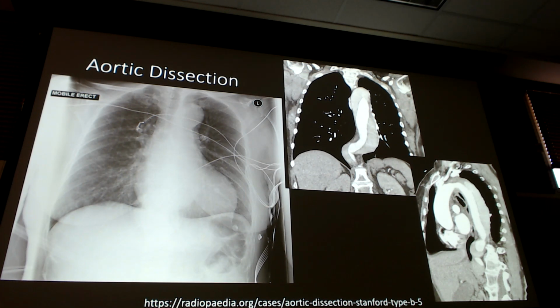Blood, because of pressure, got in between those 2 layers and started going down and ripping and tearing the wall layers apart. And so now what you have here is almost like a pseudo aorta behind this wall layer where some blood, and therefore contrast, is getting in. That's what your dissection looks like. It's contrast in both, but one is more than the other because a little bit's getting in behind that wall tear.